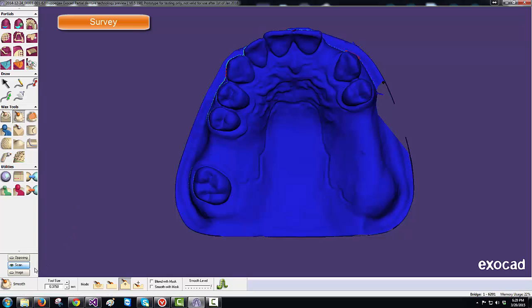Down here it shows you what is displayed on the screen, and in the bottom corner is the current or active tool. Each time you select a new tool in the tool palette, you get a different dynabar down below with different flavors for the tool.